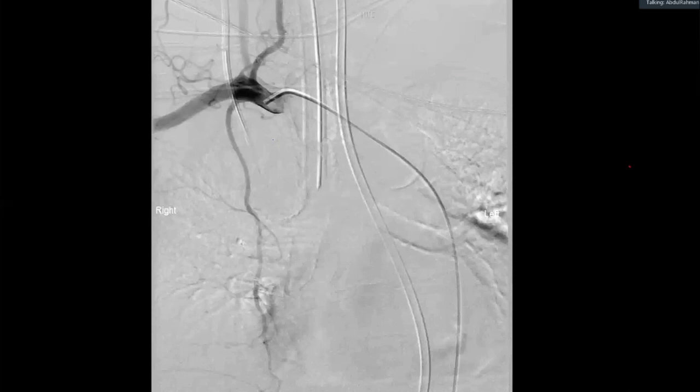So where is this catheter, and what has it opacified? This is a selective angiogram image, and I think that it has opacified some branch of the celiac trunk. Where are we at the moment? Now this is a DSA. We are superficial. Where are we? What are these? I can appreciate these are the bilateral renal arteries and abdominal aorta.